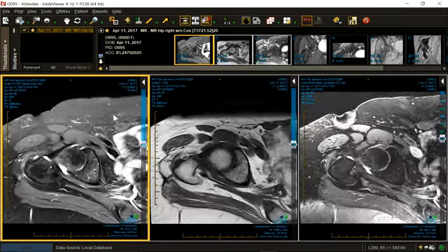But the ones that run up and down, especially if they don't have a lot of gap to them, you can cut right by them in the sagittal projection, thus illustrating the need for multi-projectional imaging for labral tears, whether you put contrast in the joint or not. But the better you get, the less you're going to want arthrography. In fact, I find a non-arthrographic hip MR easier to interpret and more accurate than an arthrographic one.